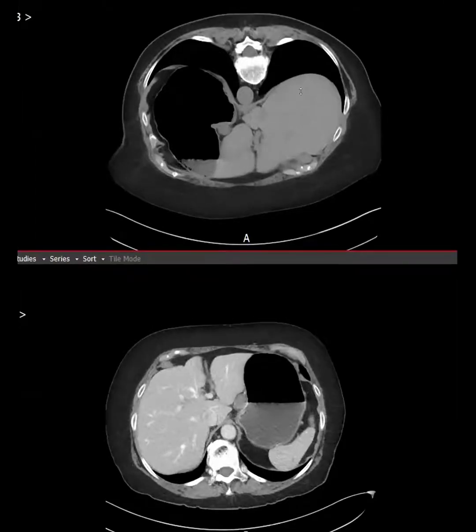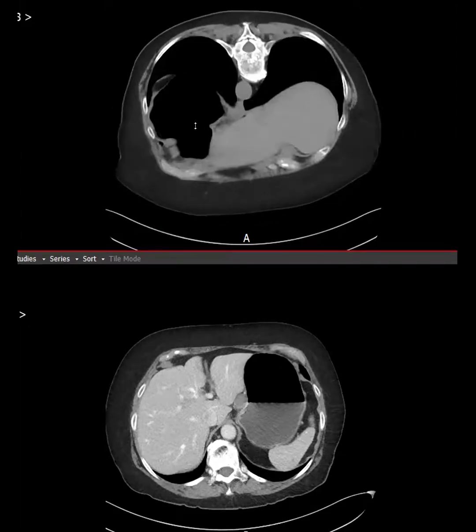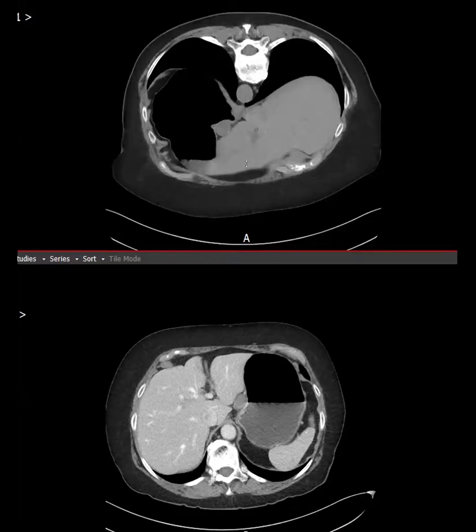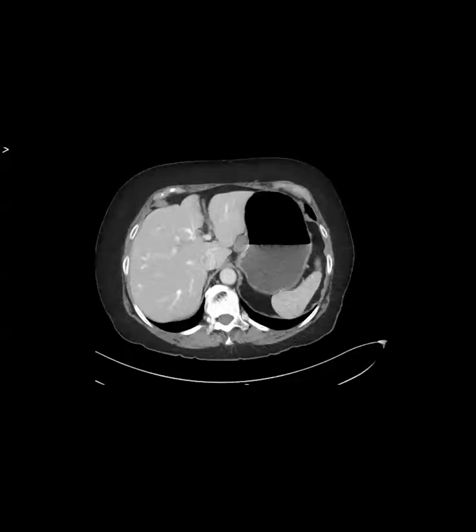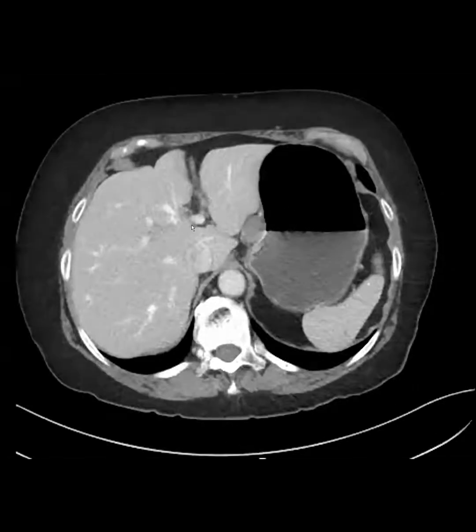So we have this surgeon at our place, and each time there is a stomach lesion, we get a prone and a supine. This is non-contrast. We clearly see the mass here. Let me just focus on the post-contrast one. Do you do prone and supine in case it's a diverticulum, to see if air and fluid are changing?